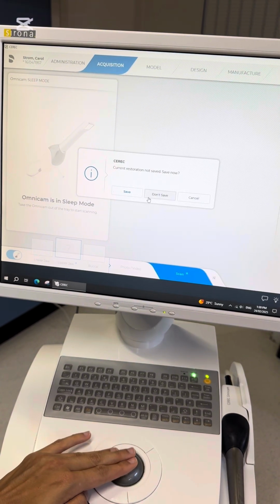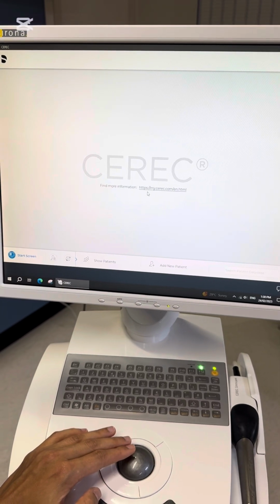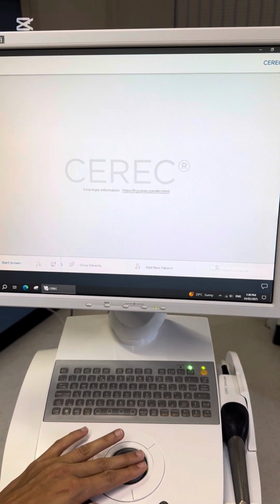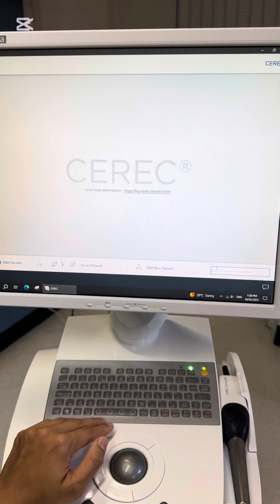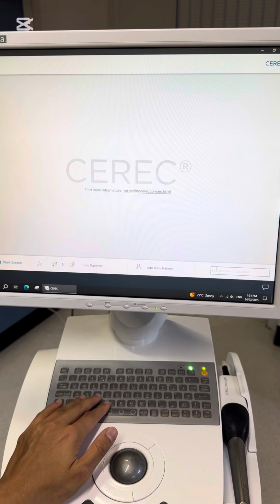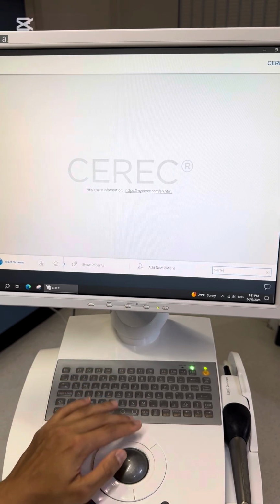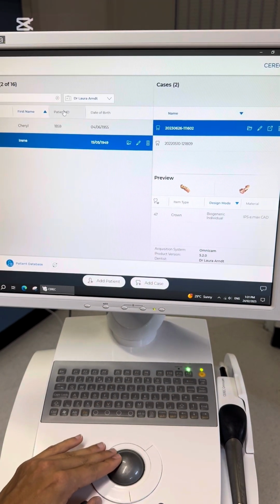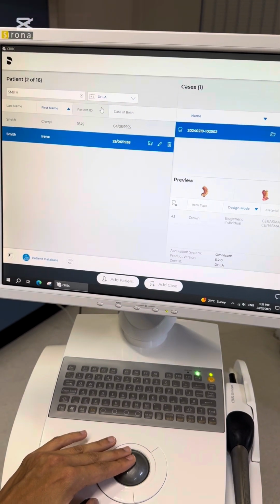So now I'll quickly run through how to enter a new patient in if they're not in the program. So we always search the patient database. So we'll search for a Jane Smith. So we put the name Smith in, click enter, and then we click down the list of dentists and just search.